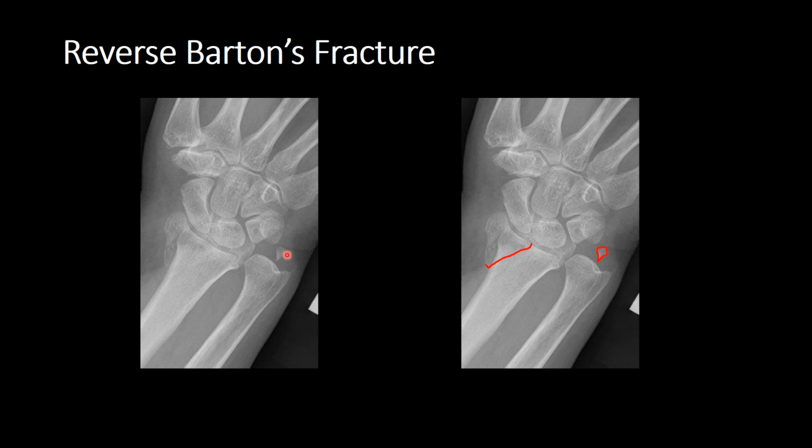A significant portion of fractures to the distal radius will involve either the ulnar styloid process, which is involved here, that little bit there, or the distal ulna. So it's important that when you evaluate all your PA views, you scrutinise your ulnar styloid process and your distal ulna very carefully to make sure that there's no additional fracture through there.